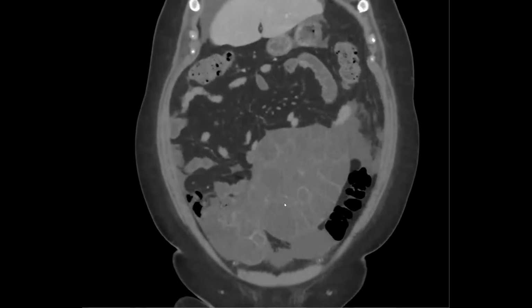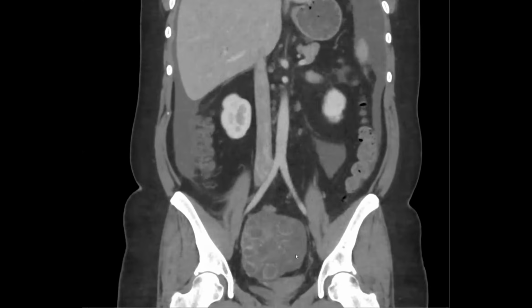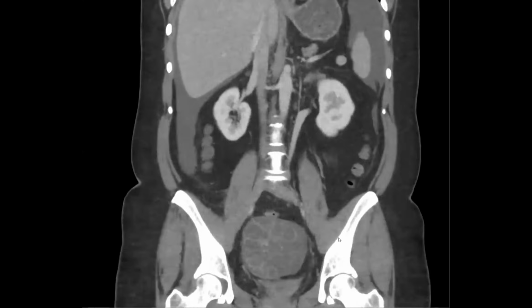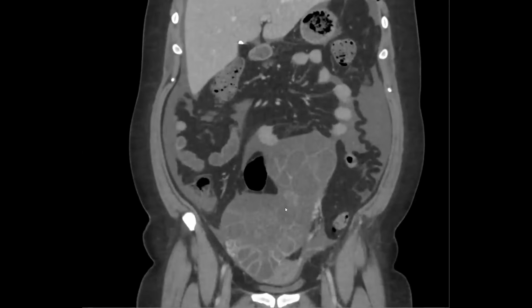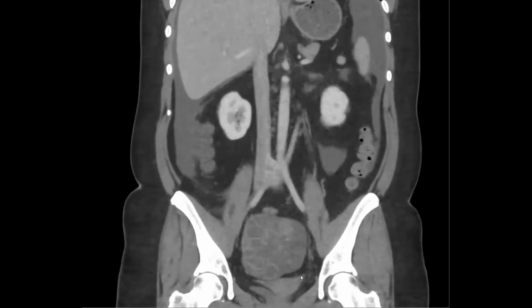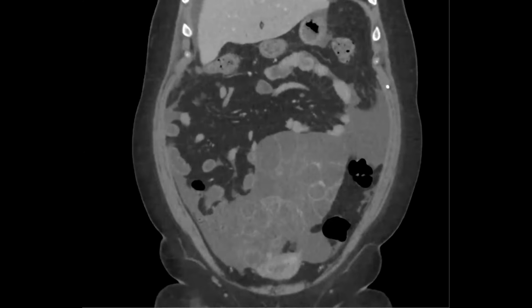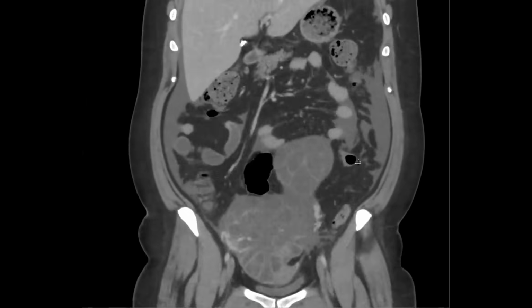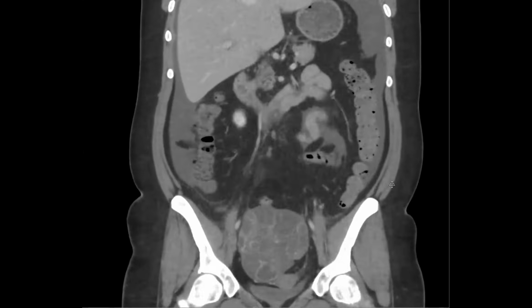So these are huge ovaries with lots of hyperstimulated follicles. They ended up getting around 30 eggs, so that was good. And when they harvest eggs, they basically get a little tiny egg at the corner of these follicles. So these are probably just the leftover follicles from those eggs that were harvested. And then ovarian hyperstimulation can lead to ascites and effusions. It can also lead to torsion. They just treated her conservatively and she did fine.